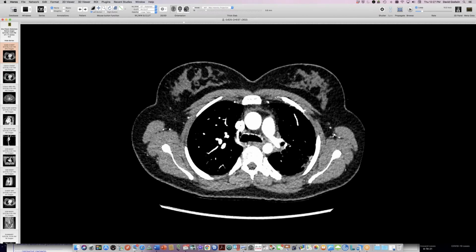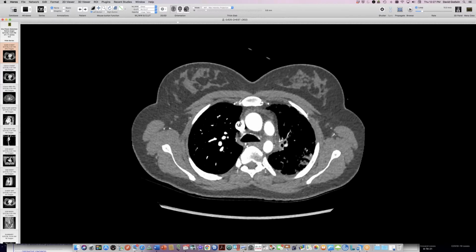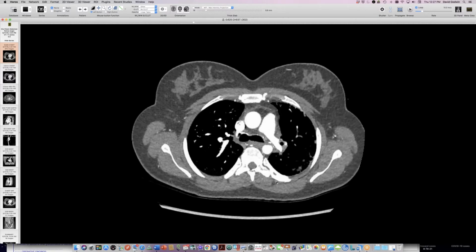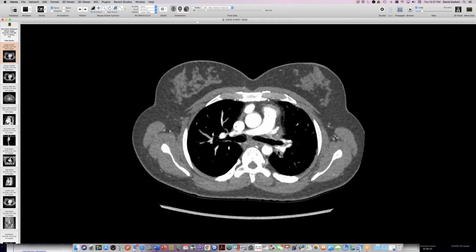You can see this pulmonary artery starts out into the left lung, and then it just sort of tapers off to nothing. So she has some branch stenoses, and this is all part of a syndrome, which I'm sure you all have heard of, and I have trouble spelling. It's called geleophysic dysplasia. I expect others to have written the definitive articles on this syndrome, but I've never heard of this before.